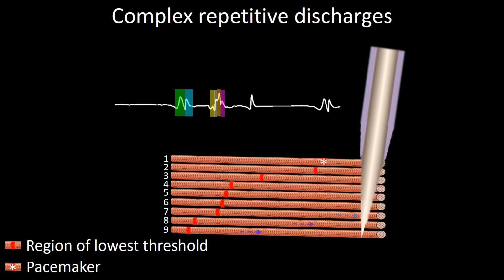Further advancement of potentials in fibers 7, 8, and 9 continues, and the action potential in fiber 7 reaches the needle recording area, generating another discharge. Shortly after, the fiber 8 action potential reaches the needle, as indicated here, triggering another discharge, and finally, the action potential in muscle fiber 9 reaches the needle, generating the last potential of the group.